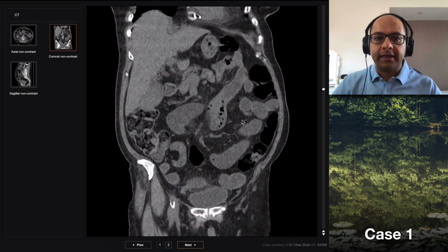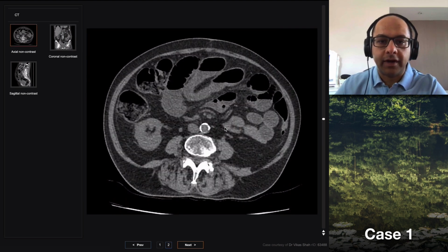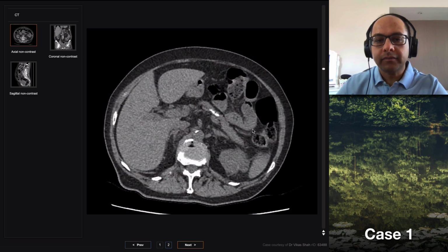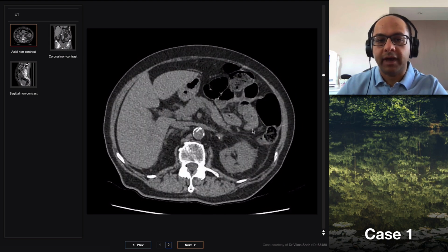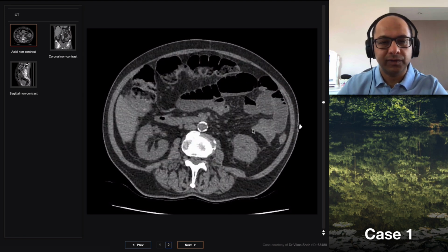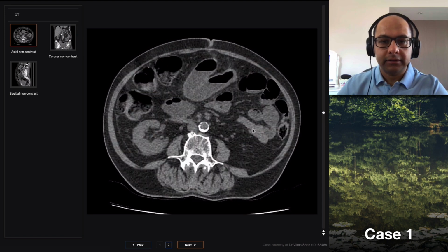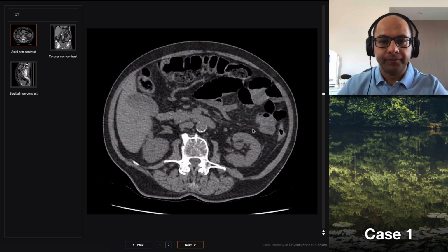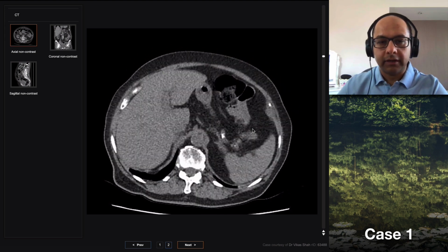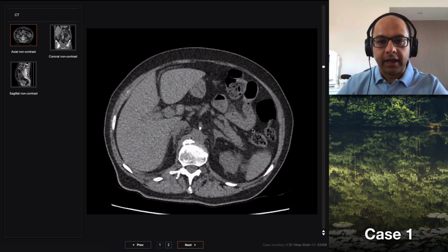Okay. I know we don't have contrast on this CT, but what could you look at with regards to the vessels to give you some idea as to whether or not there might be a venous thrombosis? Is there anything at all? So I could look for if there was a clot that could appear hyperdense. Yeah. And there could be stranding around the vessels. Yeah, I think it's tricky.